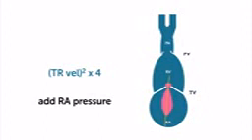We estimate it. We can estimate it from the size and the fluctuations of the inferior vena cava during inspiration, but to make things short, it's somewhere in the range between maybe 5 and maybe 15 millimeters of mercury. So you add this value to the value we gave you before, the 36, and that would give you what we call the systolic pulmonary artery pressure. Might sound complex, but if you do it several times, you will easily understand how it works, and it will give you very valuable information.